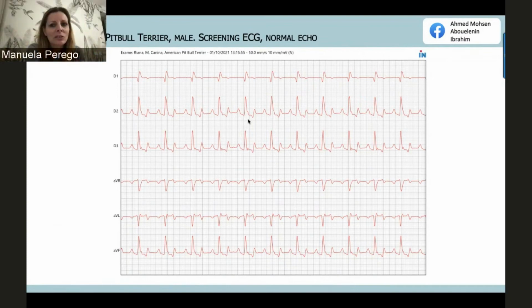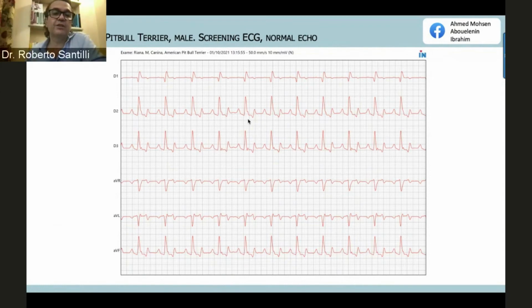Thank you very much. And Catherine Partington is asking regarding this ECG, so ECG4, would it be wrong to have isorhythmic AV dissociation with a junctional rhythm as a differential diagnosis? Okay, this is a good point. The only thing is that it is very unlikely, because usually with junctional tachycardia the PQ interval is variable, and this is not the case.